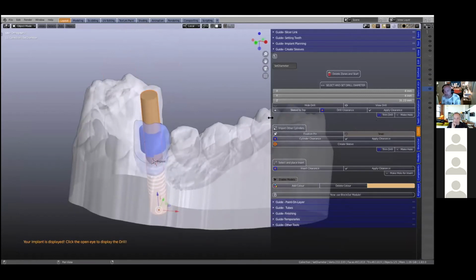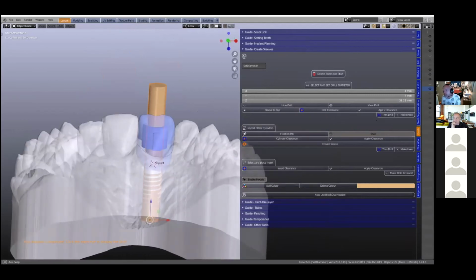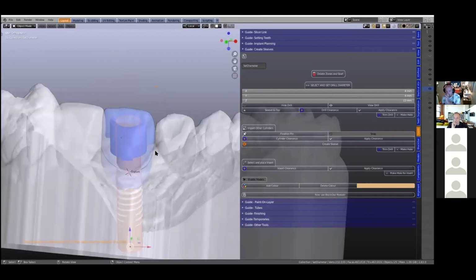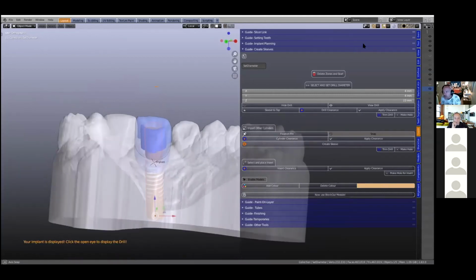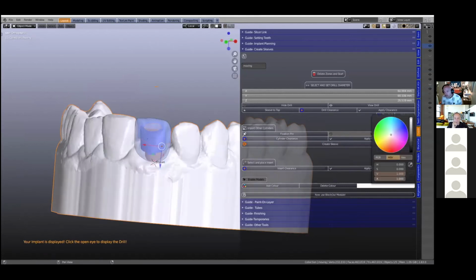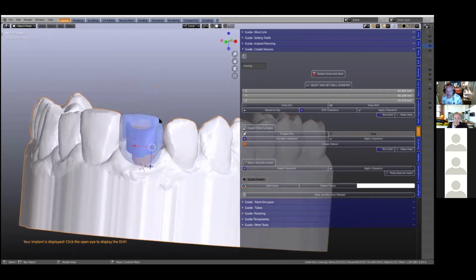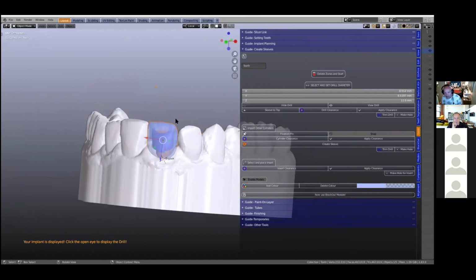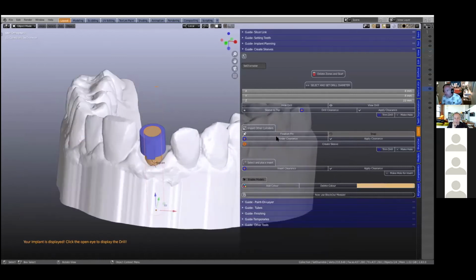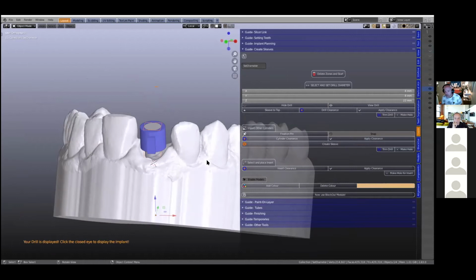So the next thing, okay, maybe we do have a setting. So if it's say 22. What I want to do after this is maybe we should give this a bit more so we can actually see the model like that. And we could possibly hide this tooth. Let's hide this tooth, so then we can at least see what's going on. Okay, so we've got the view drill, which is there, and we've got the hide.